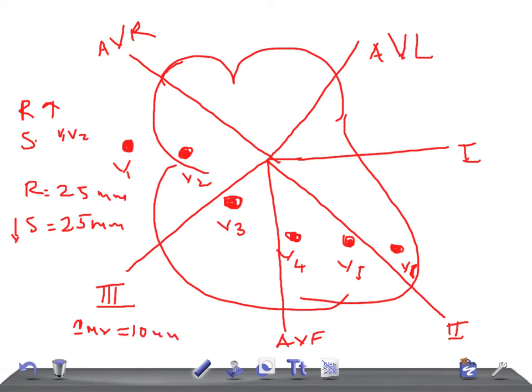And if the calibration is exactly right, then the patient might have left ventricular hypertrophy, right ventricular hypertrophy, posterior myocardial infarction, Wolff-Parkinson-White syndrome, or dextrocardia. Regarding how the R waves and S waves change in each disease, I'm gonna discuss it in another video. Okay guys, this is really very important: the basic rules and normal variations of R and S waves in EKG leads.